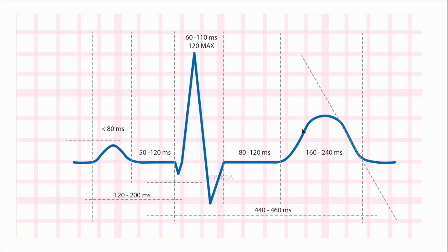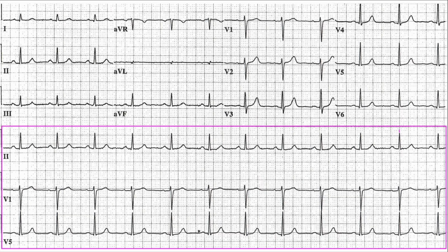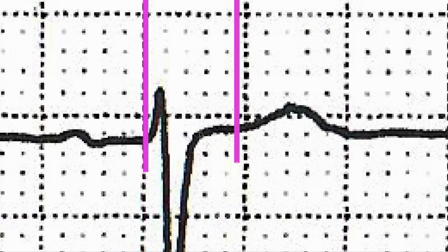And when it comes to your QRS, your J point is kind of tricky. It's plainly explained as the point where your QRS comes back to the isoelectric baseline. And that's true. However, sometimes that's not easy to figure out. For example, on our little clip here, where exactly is your J point?